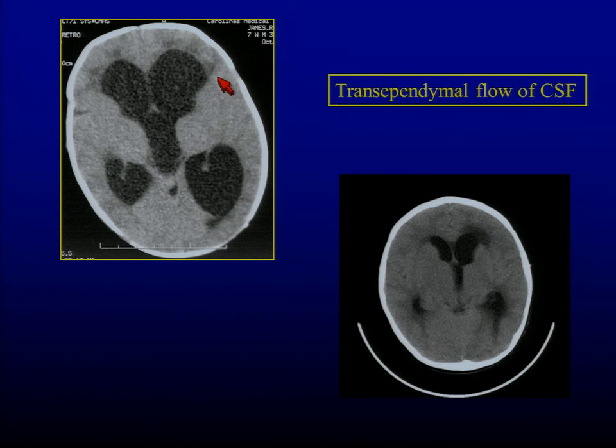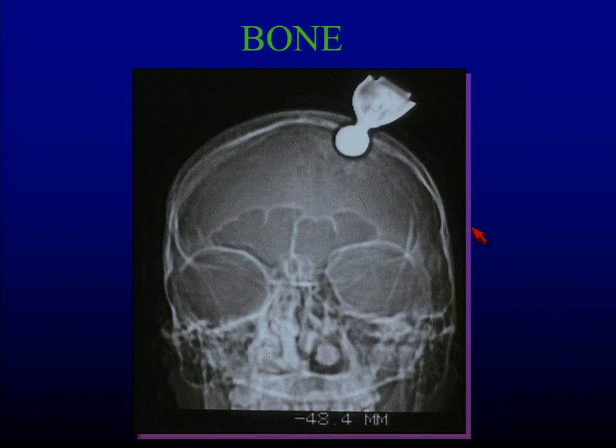When the ventricular system cannot figure out what else to do with water, the ventricles are as big as they can get. All the gyral pattern is gone. There is no other place to put it. It starts just squirting. It will exceed the pressure that can be held in the ventricular system, and it squirts out into the substance of the brain. That's a premorbid finding. This is an extremely high ventricular pressure.